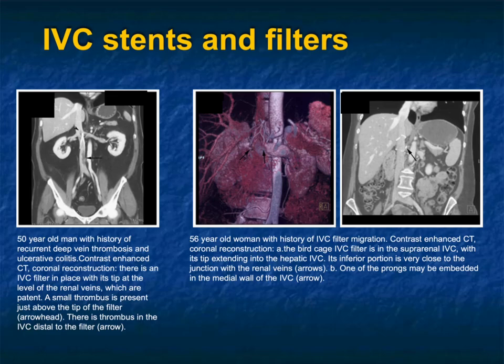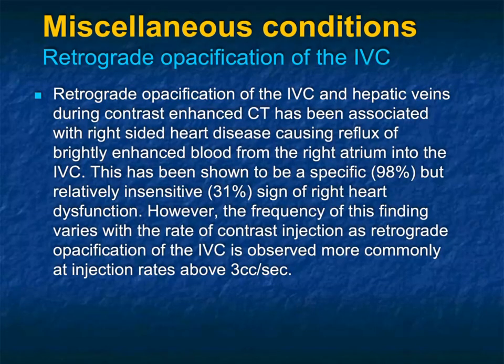It's very close to the level of the renal veins, and one of the prongs appears to be embedded in the medial wall of the IVC. All important findings. So look carefully. IVC filters are used very commonly, and complications do occur.